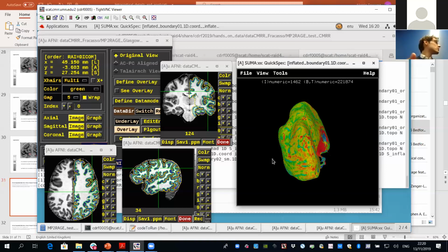If you don't, there are two options. Either the segmentation is wrong, or there is some inhomogeneity in the acquisition. And I saw that many, many times. So this not only is interesting from a neuroscientific point of view, but it also is a good probe to check whether the segmentation worked properly, or if the acquisition has some inhomogeneities within itself that are not clearly noticeable just by looking at the anatomy.